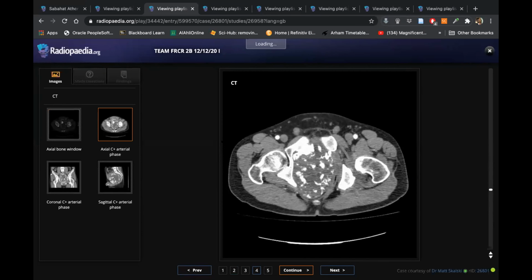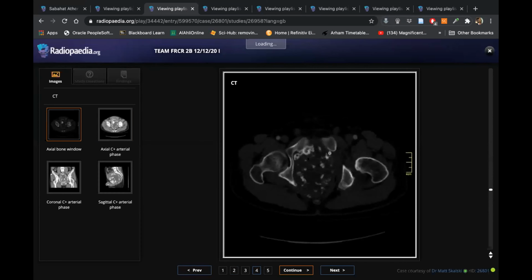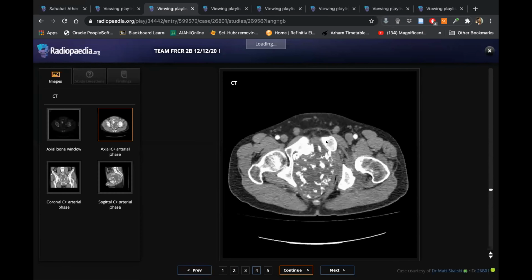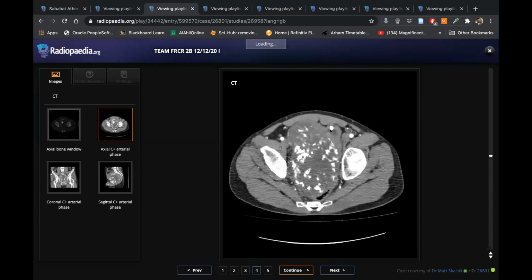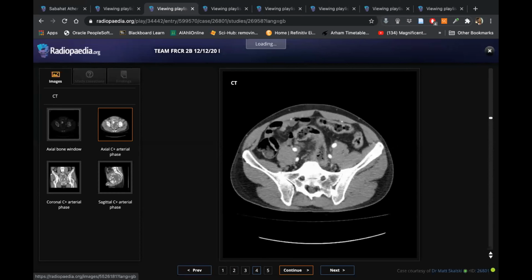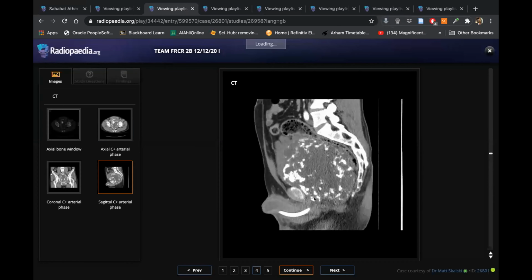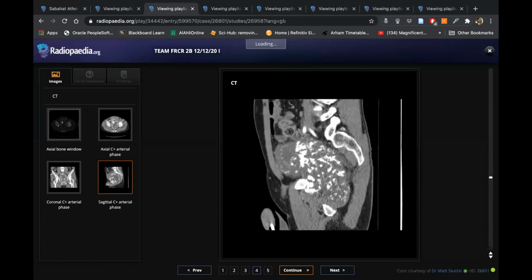Okay. Maybe it came out from here, from the inferior pubic, from the posterior aspect of this pubic symphysis. But whatever the cause, this is a malignant degeneration. So it will go to the sarcoma center, and there everything will happen, right? We could trace the urinary bladder. So this was not urinary bladder, but this was a tough case. But ring and arc-like calcification, these are the words which we will use.